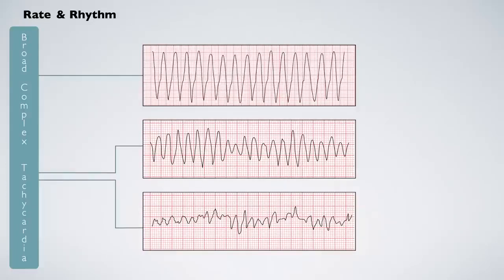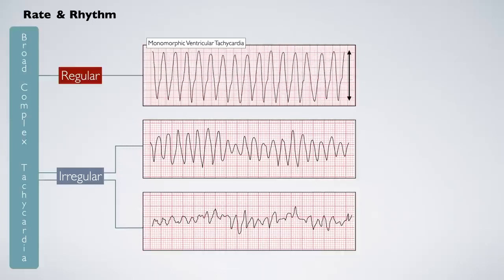They can be divided into regular and irregular rhythms. If there are 3 or more broad abnormal QRS complexes in series that occur with regular intervals and have a similar height and shape, this is likely monomorphic ventricular tachycardia. Note, however, that some rhythms can mimic this. It is subsequently useful to be able to identify specific features that are only present with ventricular tachycardia.